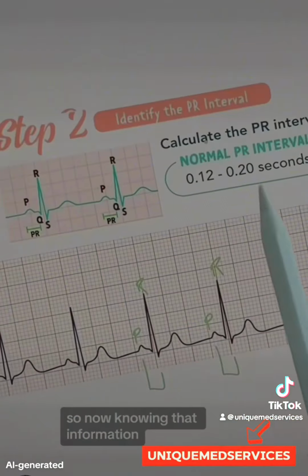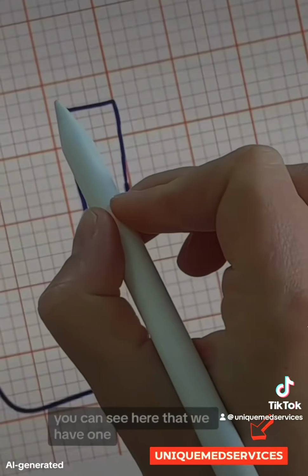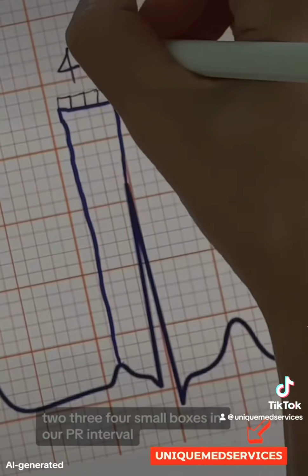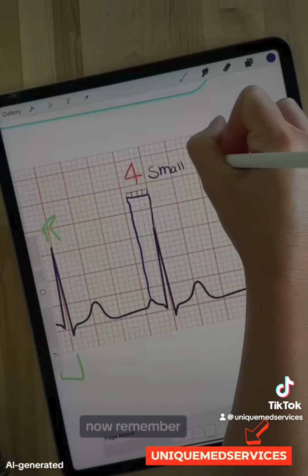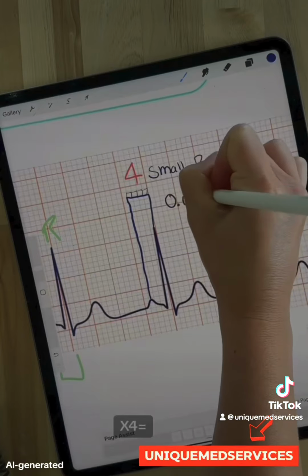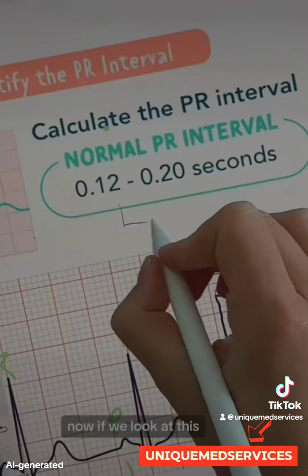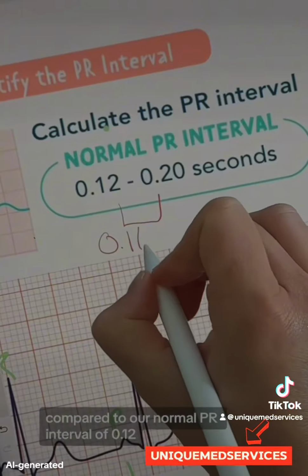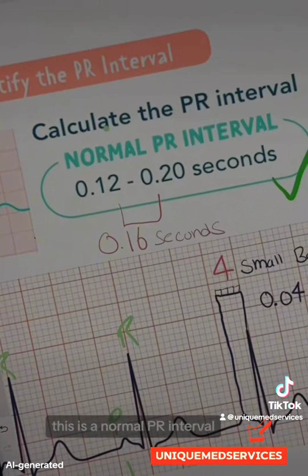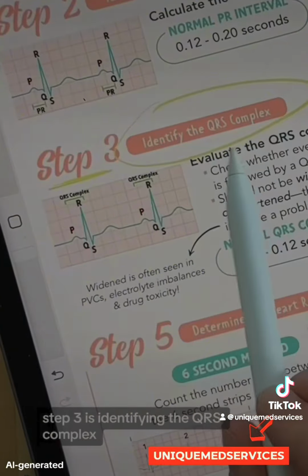So now, knowing that information, we can calculate the PR interval. You can see here that we have 1, 2, 3, 4 small boxes in our PR interval. Now remember, each small box is 0.04 seconds. Times this by 4, you get 0.16 seconds. Now, if we look at this compared to our normal PR interval of 0.12 to 0.20 seconds, this is a normal PR interval.